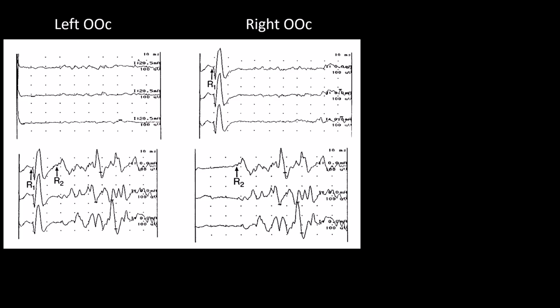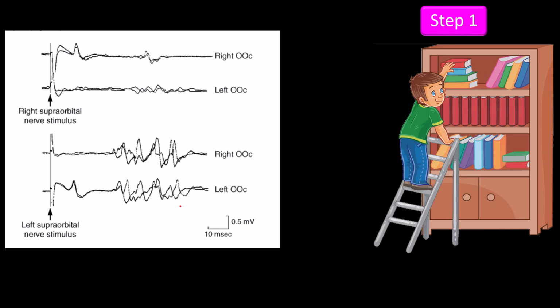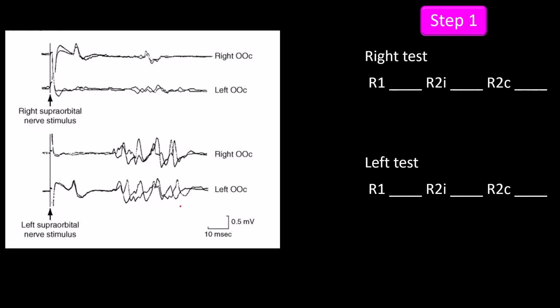This is the usual presentation of a blink reflex test waveforms, but you may also encounter this representation. The approach is the same. The first step when analyzing blink reflex test waveform is to create a platform that displays the results in a systematic and clear way. I find this arrangement satisfactory, but we will go over the positioning of each of the elements because of the new wave presentation.